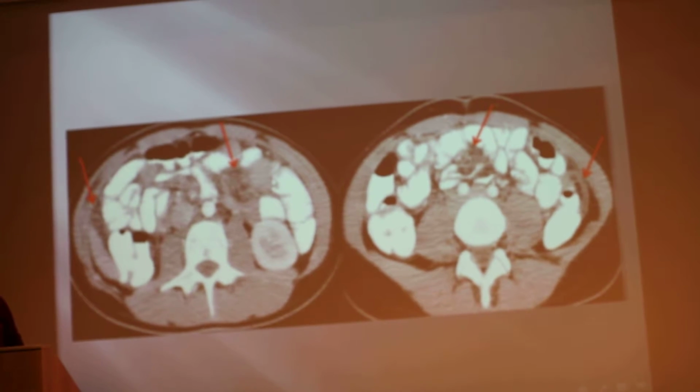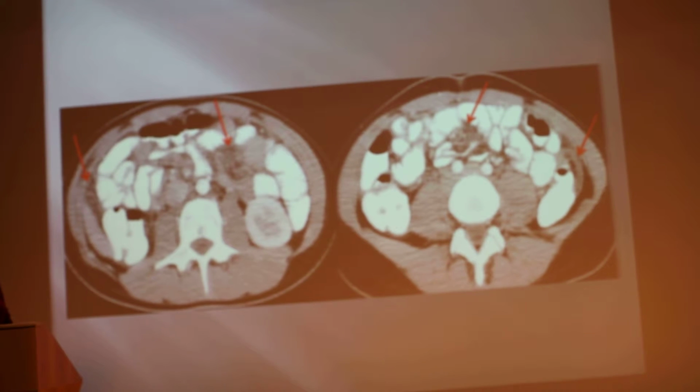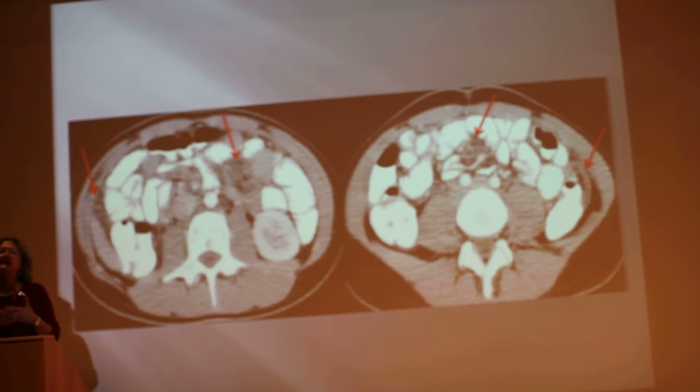It's very difficult to diagnose that we are talking about endometriosis. It looks exactly like peritonitis. What we see is infiltration of the fat at the omentum, at the mesentery, hyperemia of the mesentery. There is nothing specific that can lead us to the diagnosis of endometriosis. So we always should combine the clinical presentation with what we see in imaging.